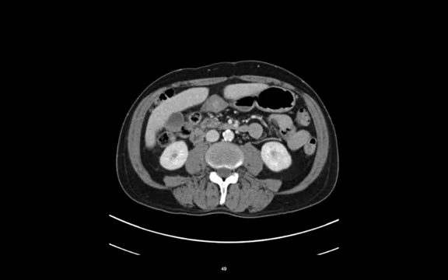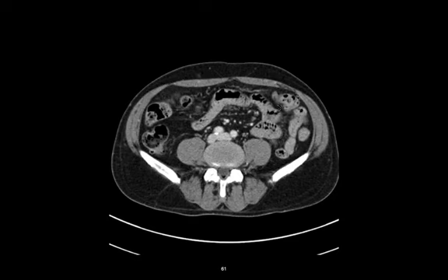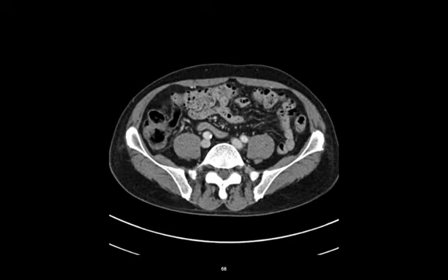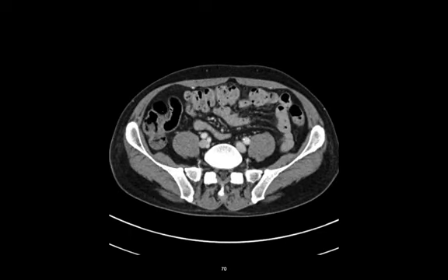I'm not going to make you distinguish between the different parts of the intestine, but we know up here in this area is probably going to be jejunum, and down here is probably going to be ileum. And these are probably large bowel with haustra right here. And there's our transverse colon going across with the different haustra. That's probably flatus inside there, or eventually going to be flatus. But I'm not going to make you distinguish between those.